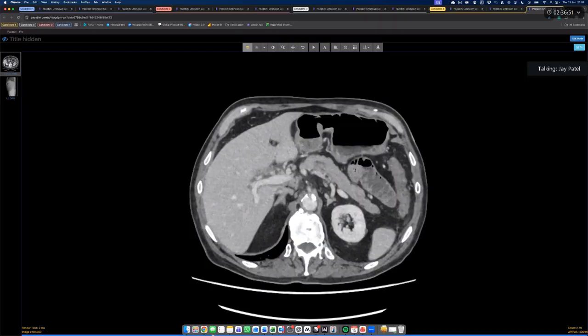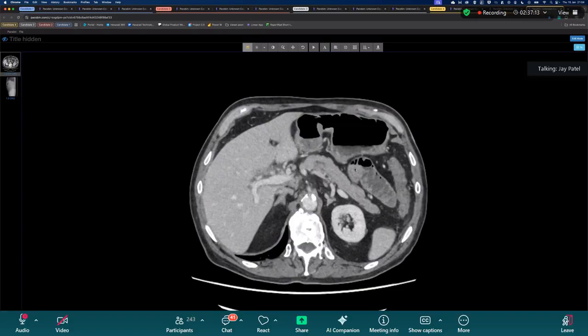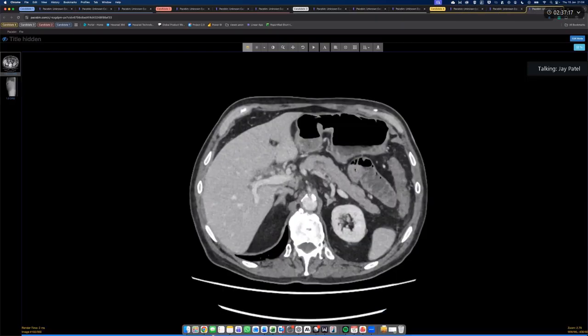So sometimes with a migrated gallstone ileus, you will not see the gallstone on CT, but what you will see is a very sudden transition. Big to very little. And actually what you've got at the junction of the big is a gallstone. It's just very difficult to make out. So don't be fooled if you do not see a calcified gallstone. Non-calcified gallstones also exist and can be a contributory cause to a gallstone ileus that you don't necessarily see as obviously on CT.